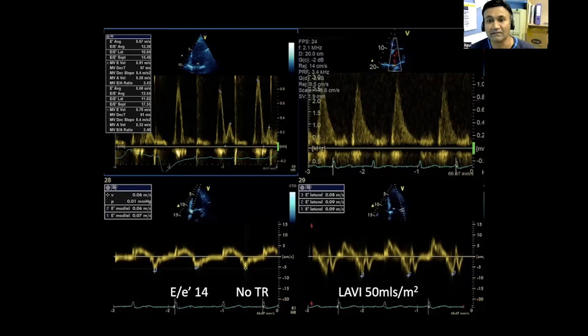I can't really see where it is. Oh, is that the pulmonary vein? Yes, it's at the pulmonary vein. Sorry, which pulmonary vein is it? Is it the upper, right or left? Right upper, left upper pulmonary vein. Sorry, right upper. It's close to the right atrium. So yes, the right upper pulmonary vein. Very nice. And what can we see?